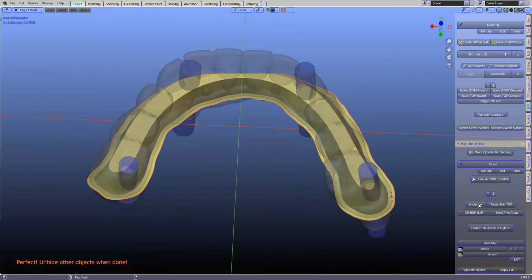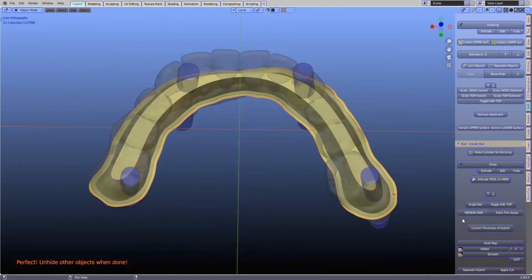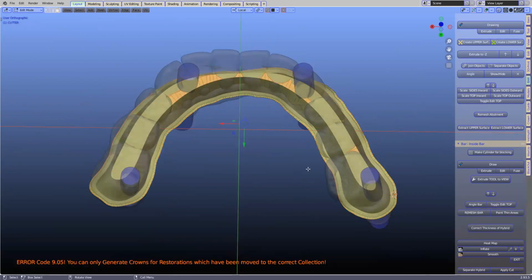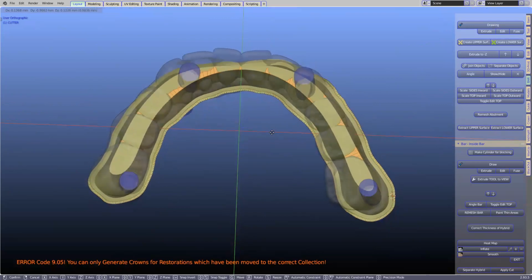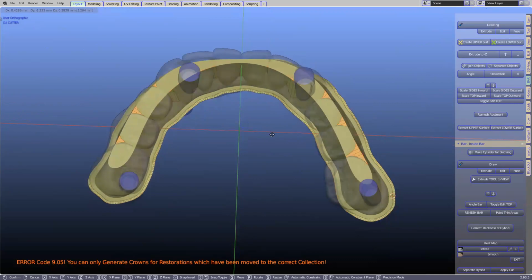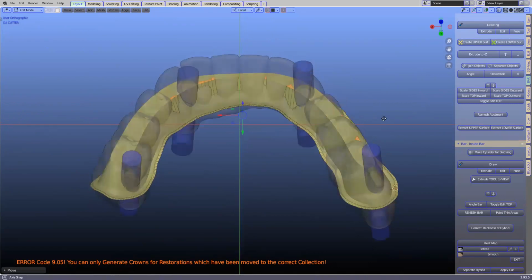So you don't really have too many buttons on this particular menu bar. No, you just have to sort of understand how it works. And also that it's a compromise between reshaping the bar and reshaping the denture. It definitely is a compromise.